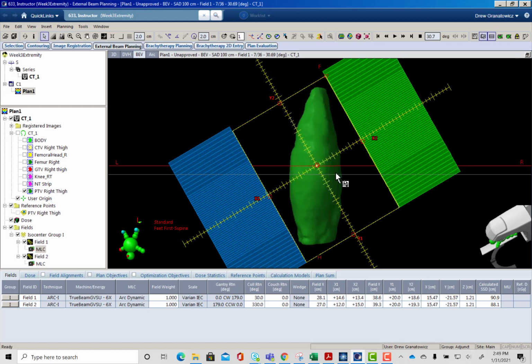So what you want to try to do most of the time is limit your total X distance to about 15 cm or less. But in my experience, you can cheat to like 17, 18 without too many consequences. So usually I try to keep mine at like 17 or 18. But you also can just look at the situation and determine what you want to do.